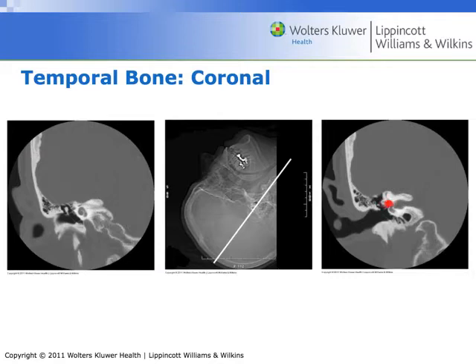And the one that goes off to the side is the lateral semicircular canal. The epitympanum. This little white spot right there is the incus. And then of course this long black line here is the external auditory canal. That's the part of the ear that we can actually visually see.